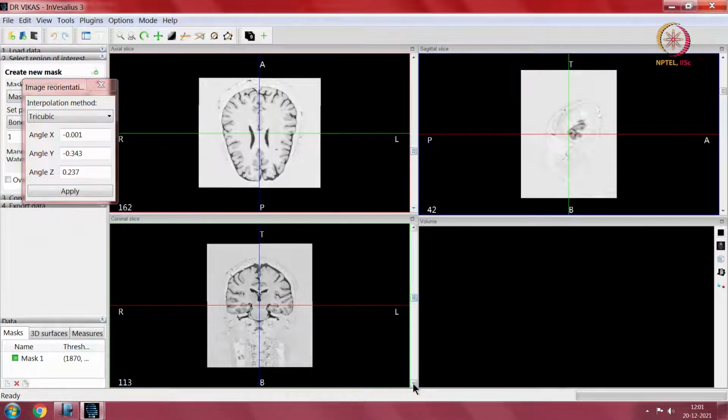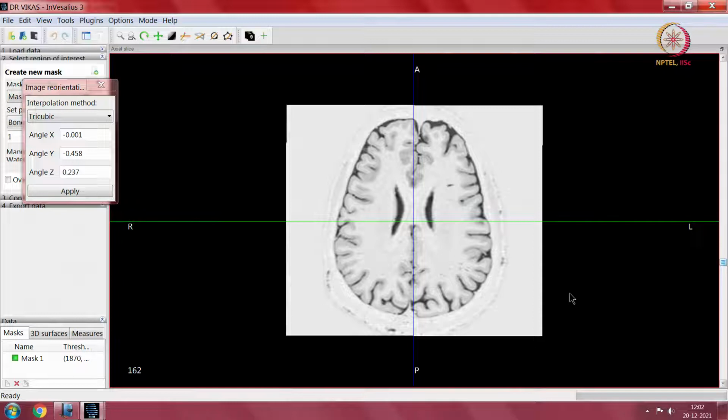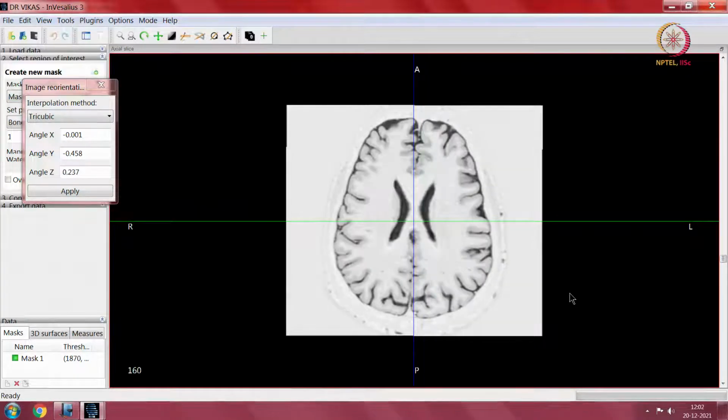This is a coronal section. What you can make out is the ears. So, we will start our run of anatomy through the axial images. This is how the image looks.